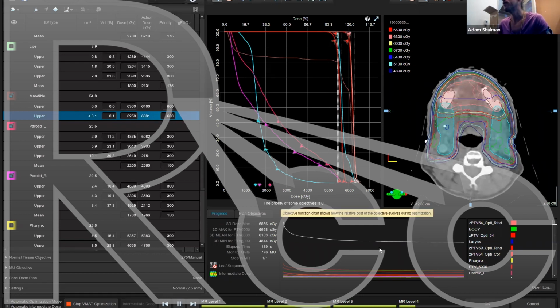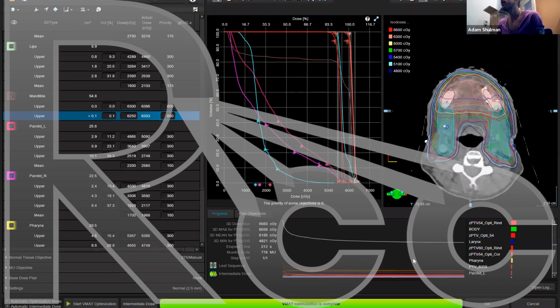If you're worried about needing extra flash for something that can have swelling or setup errors, so things like vulvar cases, then you'd want to add a flash. This is a bit complicated, I think, to explain in 30 seconds, but maybe we can touch on this in another session, or I can send out an email to the group.